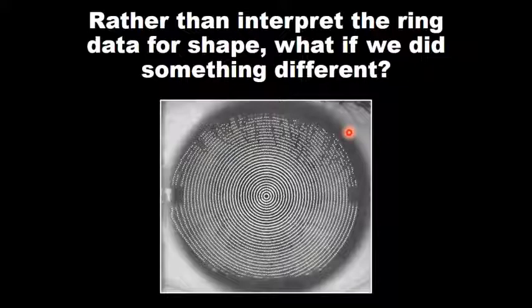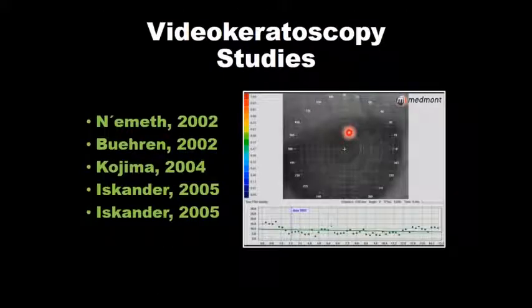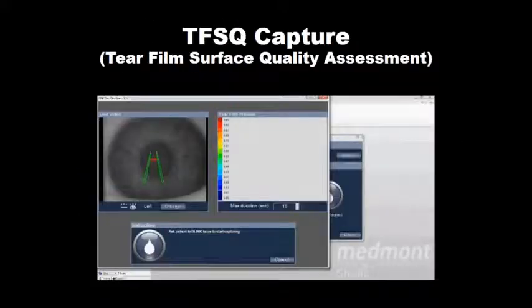So although this patient has a single capture that gives us about 10 millimeters of information, using the composite feature, we can get the full visible iris. And this becomes very important related to some of today's rigid contact lenses. As an example, the standard 9.0 diameter is used less frequently today. We're more often using a 10 or 11 millimeter diameter lens.